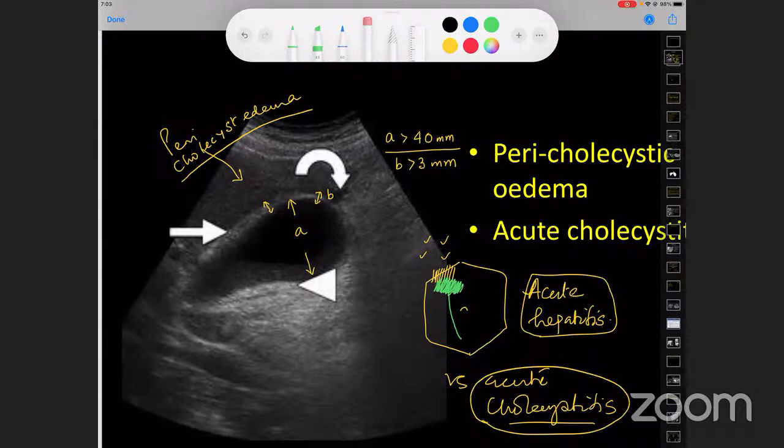And number two, this is a very important point radiologically. You could see a thickened echogenic periportal soft tissue. This is very important, and we see this on ultrasonography, on CT scan, and on MRI also. We call it echogenic on ultrasonography, thickened hypodense on CT scan, and thickened hyperintense on MRI. There is a significant periportal soft tissue thickening in a setting of acute hepatitis. Number one. Okay, sorry, my screen just got off. Just a minute.